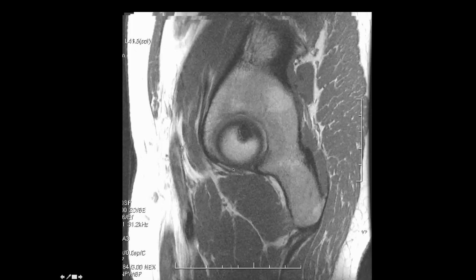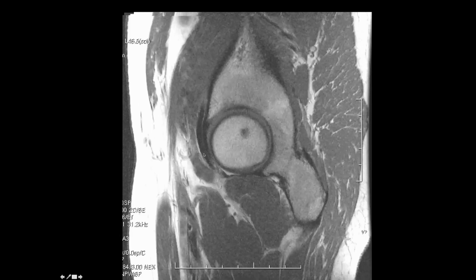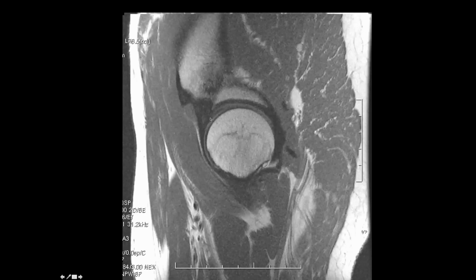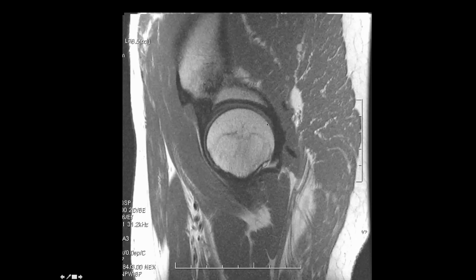On sagittal images, we see the transverse acetabular ligament, we see the pubofemoral ligament, we're seeing portions of the iliopsoas complex, and as we extend from medial to lateral, we start seeing the acetabular labrum anteriorly, and this represents combined iliopsoas and also the iliofemoral ligament. Here is that anterior labrum, anterior superior labrum, extending into superior lateral, posterior superior, posterior, and posterior inferior labrum. This gray structure around the femoral head and around the acetabulum is the articular cartilage, the hyaline cartilage.